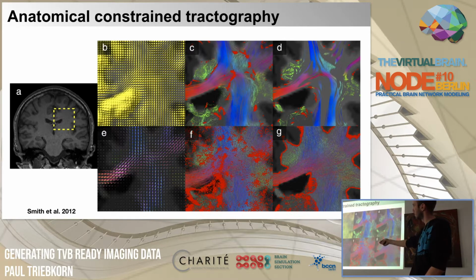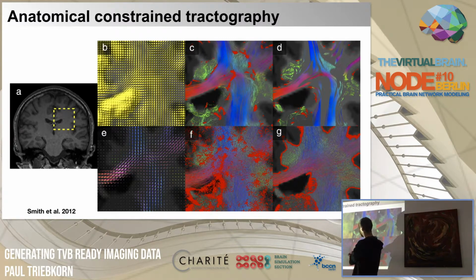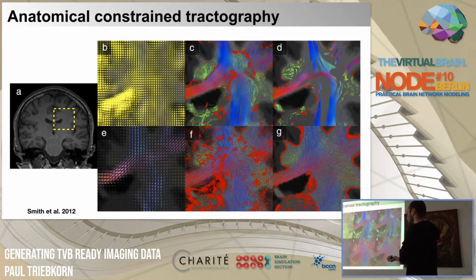Here we're looking at one brain region a little more in detail. We're actually using two different techniques here to construct the directionality information for this specific excerpt of the brain. Here, this is done with this deconvolution approach I just mentioned, and you can identify these glyphs, also representing crossing fibers, or potentially crossing fibers.